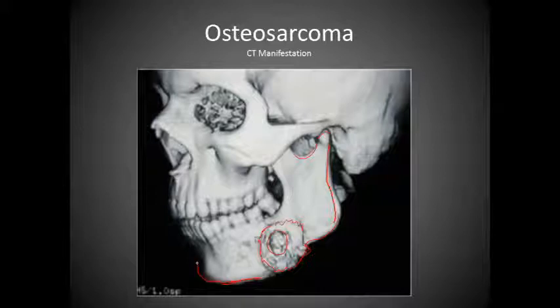And it goes smooth from here, but from this point to this point, we actually have no smoothness. It's all rough. And so it would probably be safe to assume that this patient could feel this in the mandible, and probably noticeable because of the amount of swelling caused in the soft tissues surrounding it.